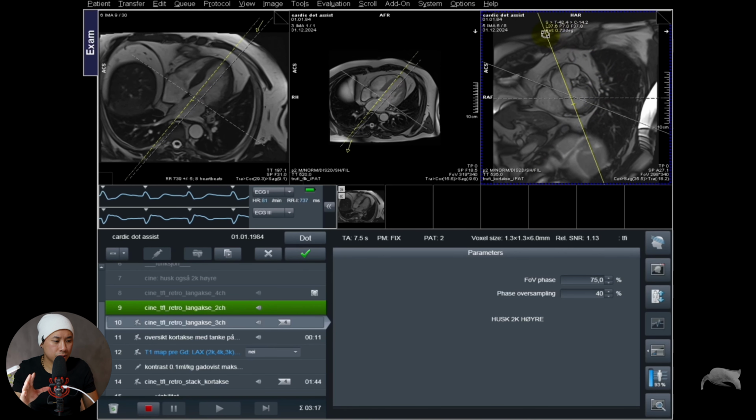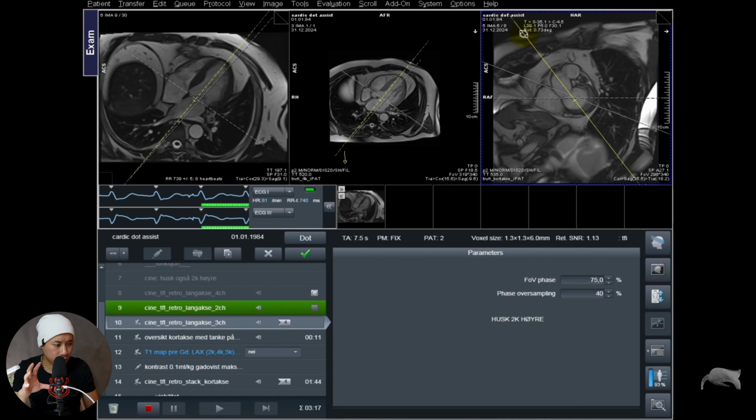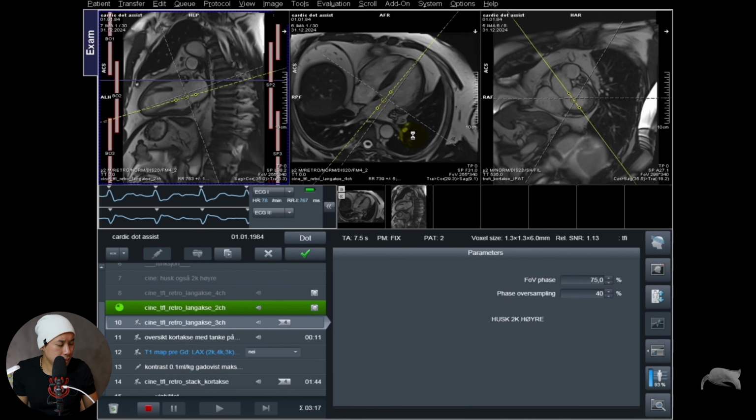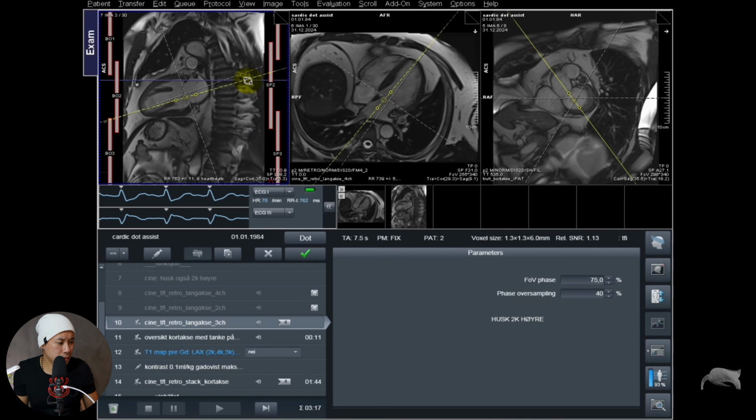I'm just gonna position all this before I show you the video, how you can turn it on and off. So if the video is still, you can just push the space key on your keyboard, and it will automatically spin the video.